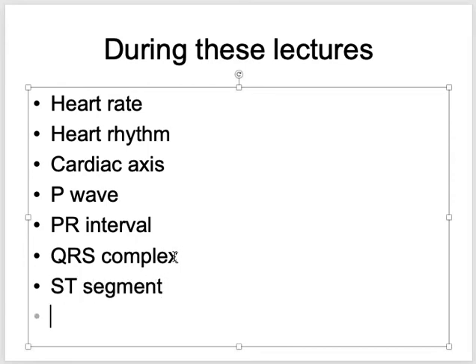Then we talk about the ST segment, right? In this one, I talked about whenever there is elevation, what could be the causes, and when there is ST segment depression, what can be the causes. A very brief introduction about the QT interval. As I told you, many people who have long QT syndrome are more prone to get arrhythmias. Okay, then I talked about the T waves.